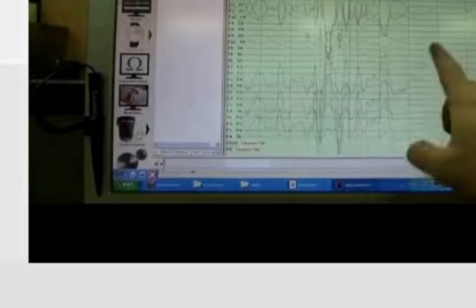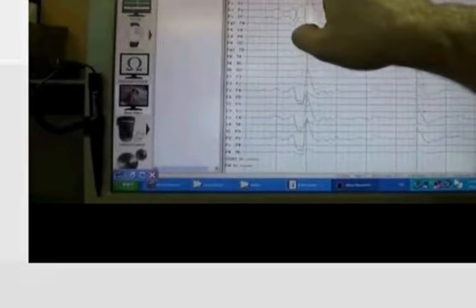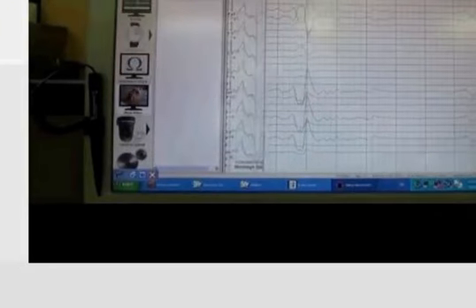Alright, so again, it's using all your fingers. You're not left-clicking and dragging here. You're just putting your finger on the title bar of a window, and you can move it about the screen. So in the touchscreen mode, it's your finger that acts as your mouse pointer, essentially. If you want to double-click on something, a double tap of your finger can be used. And again, you can left-click and drag by just putting your finger on the screen and dragging it across the screen to sort of scroll through your study. You can change montages. It's pretty intuitive overall.